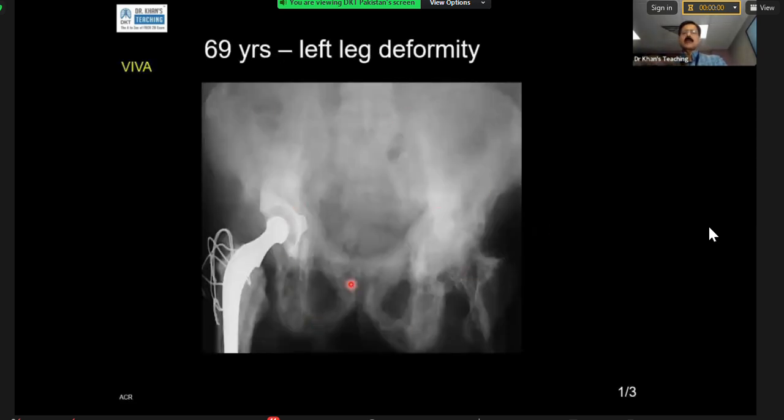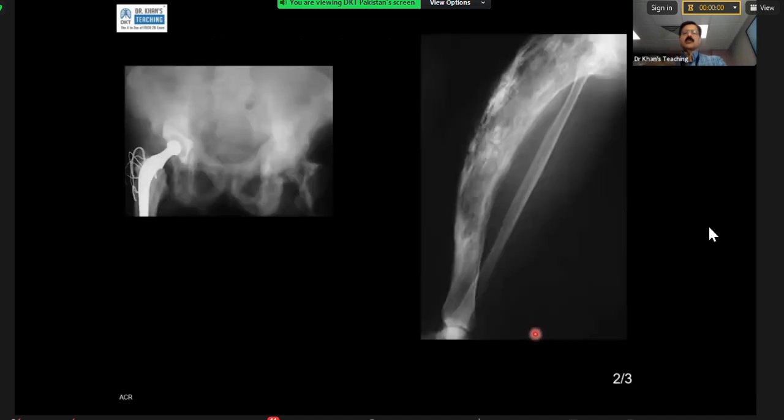Now we are covering Paget's, which is the last thing for today. I just wanted to develop your eyes on this appearance, because in the UK, Paget's disease is not very uncommon. But in some parts of the world, you won't see so much Paget's. I just wanted to show you this gross case of Paget's. Don't get confused about it. This is diffuse Paget's.